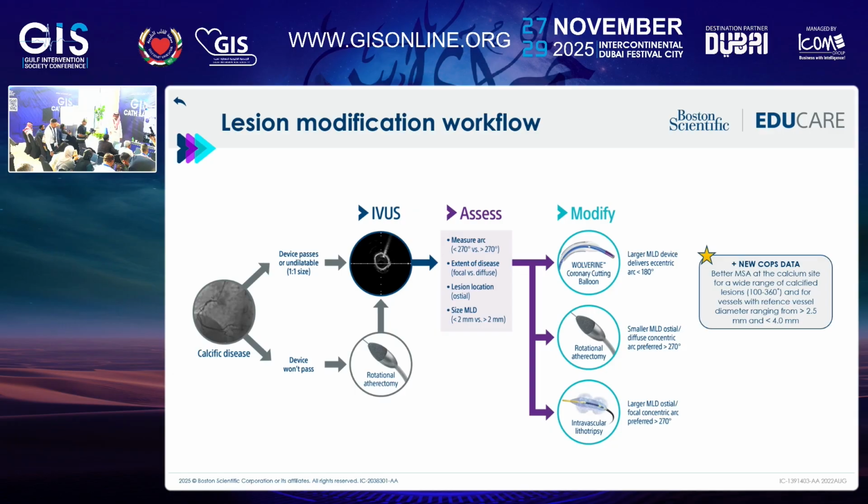The second thing is very important for us. The IVUS catheter is very small, low profile. You want to find the next information. What is the minimal lumen diameter in the smallest area? Is the minimal lumen diameter big enough to allow me to cross with a bigger balloon, or do I have to modify it with more information? That information is also available. Looking at the minimal area, the smallest now. What is the smallest area?